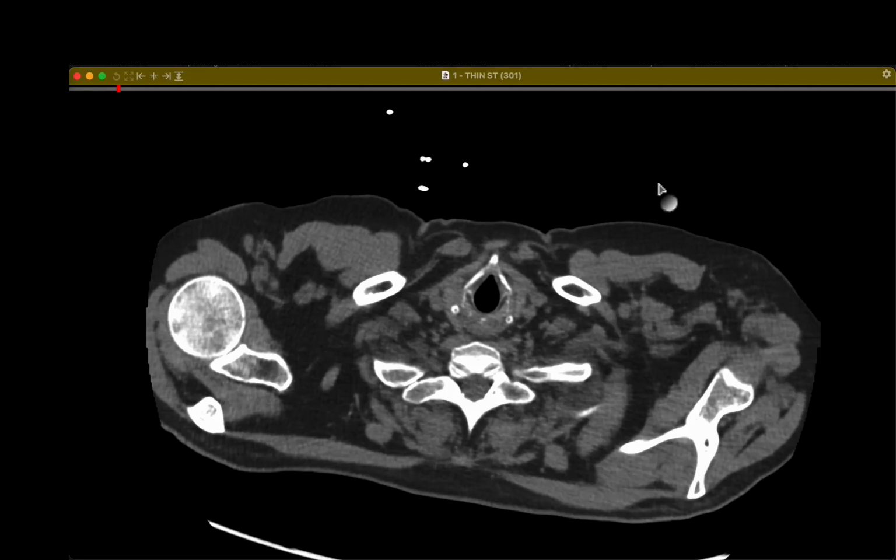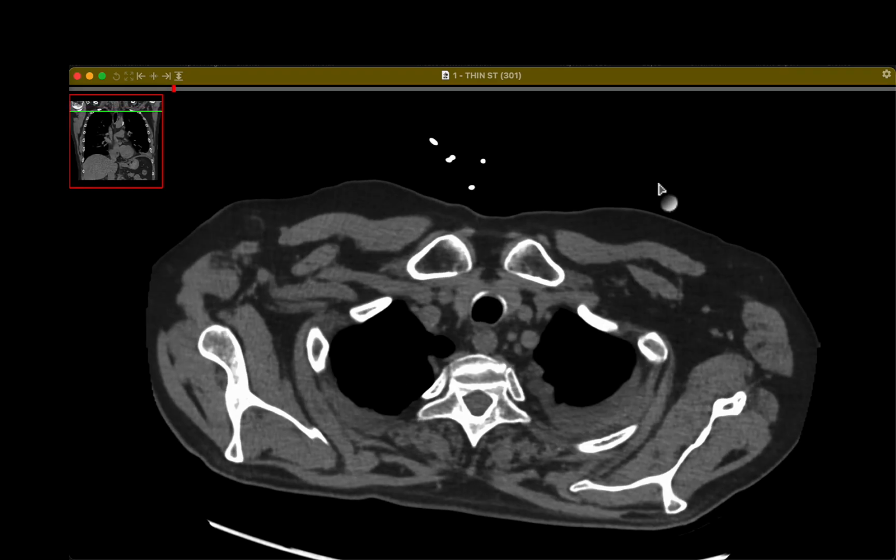I have another case to share with you. This was a 50-year-old male who presented with some acute onset neurologic changes and was admitted for further evaluation. As part of the workup, a CT scan of the chest was done looking for occult malignancy.